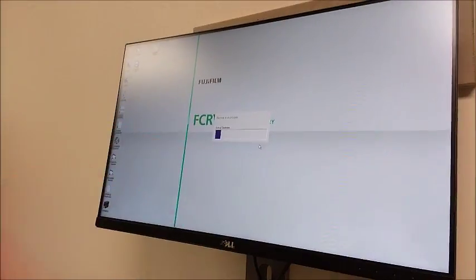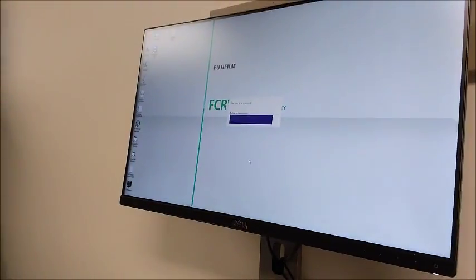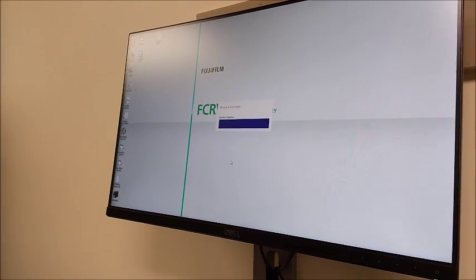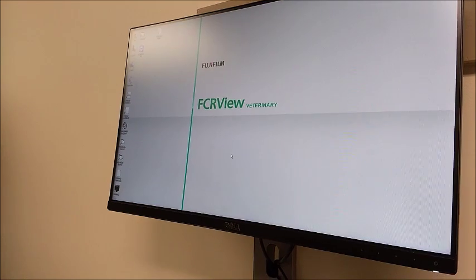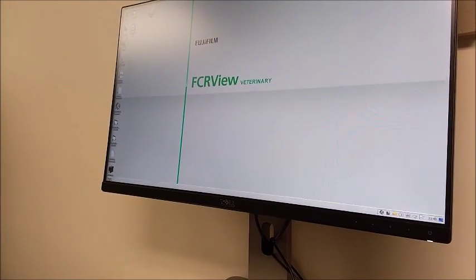That's great. It's sending its configurations to the NAS also. This should always go the whole way across and complete. If it doesn't, it'll throw an error and you can call me. Operation complete, and that was a successful application termination. Okay. At this point, we could actually shut down right from here now. Okay. So then that's what you do.